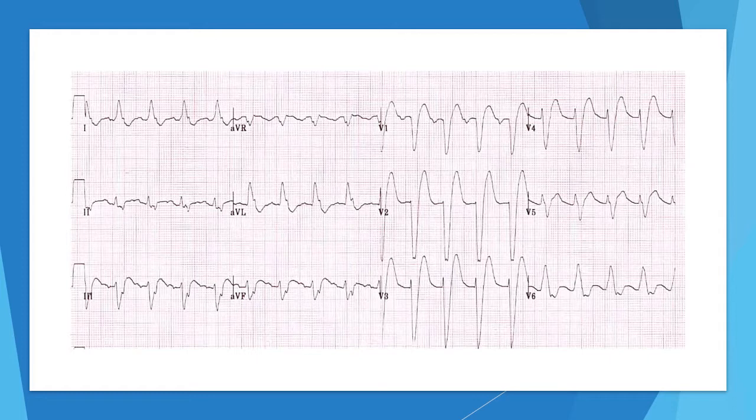The most common one I've heard is that you're driving along the ST segment, and in a fictitious car you have to turn right or left, and that'll help you determine if it's a left or right bundle. That's not 100% accurate. So that will be right some of the time. This would be a case where it would be very difficult to even make that determination, because the ST segment does not return to the isoelectric line. It doesn't involve using V6, which it should, because it has to have both to meet criteria.